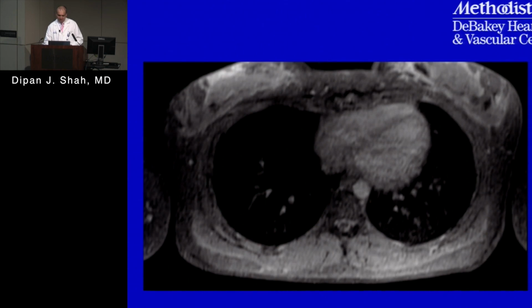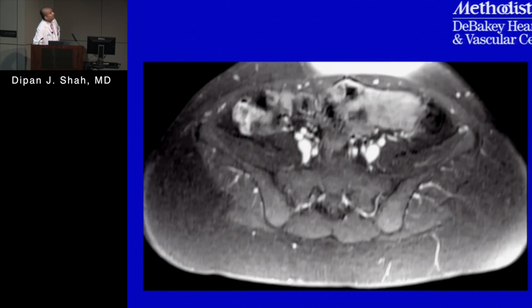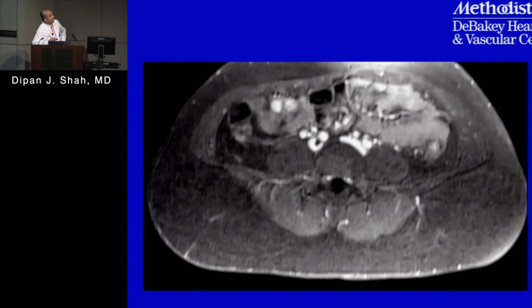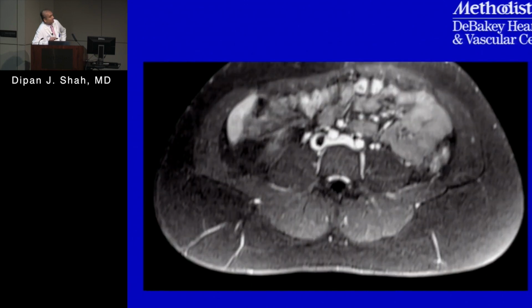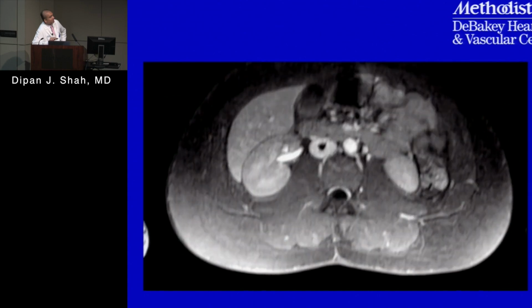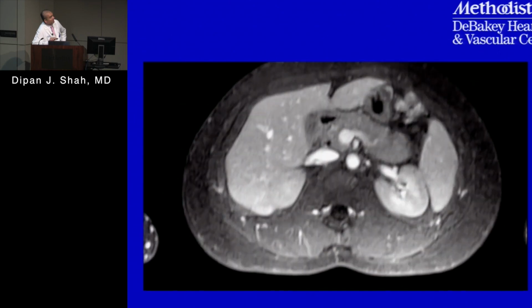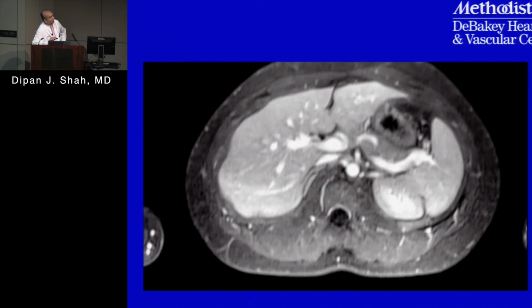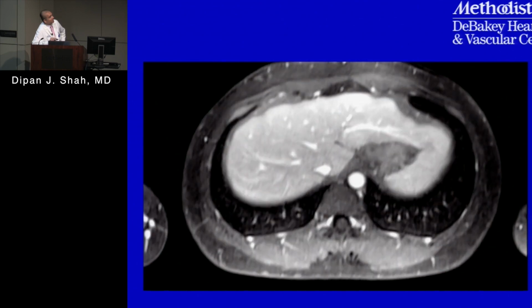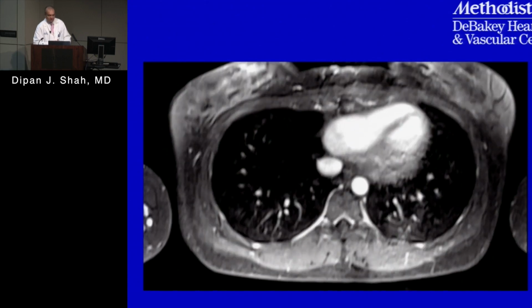Let's go through this again one more time. Okay, so those are the iliac veins and the iliac arteries coming together now, right? That's the iliac bifurcation right there. So we're now into the IVC proper. There's the left renal vein that comes in, and then there's the IVC that goes all the way up. And then there's nothing here. So really, yeah, this is a filling defect.